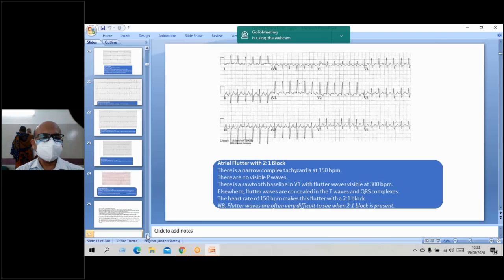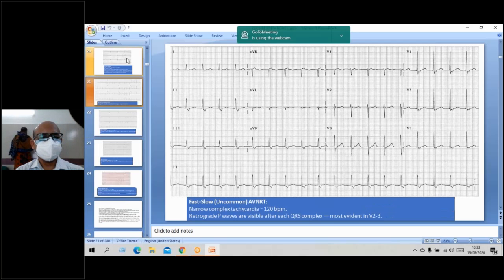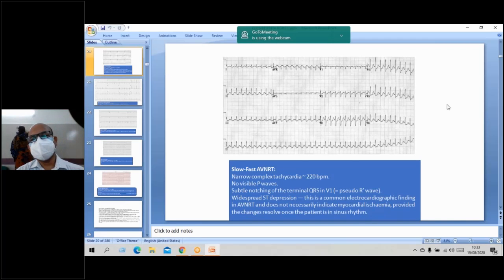Sometimes you will miss supraventricular tachycardia. This is a typical example of supraventricular tachycardia. This is another ECG, supraventricular tachycardia. Why is this supraventricular? Actually, supraventricular tachycardia is a misnomer because those tachycardias arise from the atria, that means above the ventricle. That is called supraventricular tachycardia.